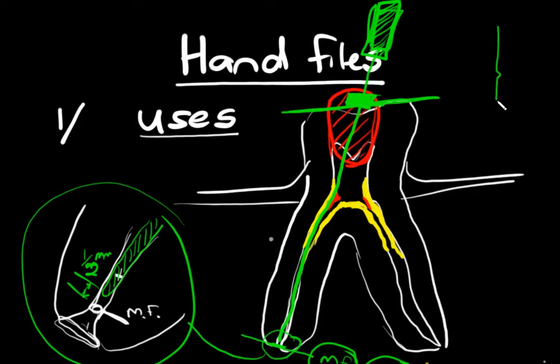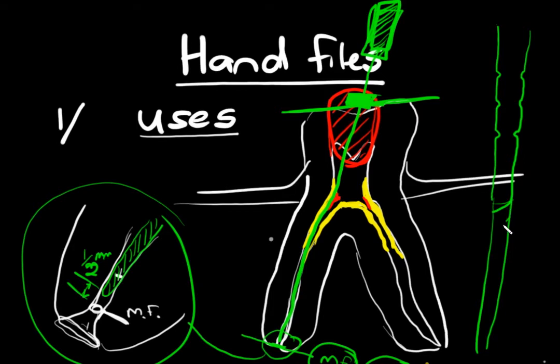It's 20 millimeters, it's 19 millimeters, it's 18 millimeters, 17, 16, and similarly on the other side, 20, 19, 18, 17, 16, and this is where the flutes start here, and the file progresses down like this, so the flutes are here on the file.